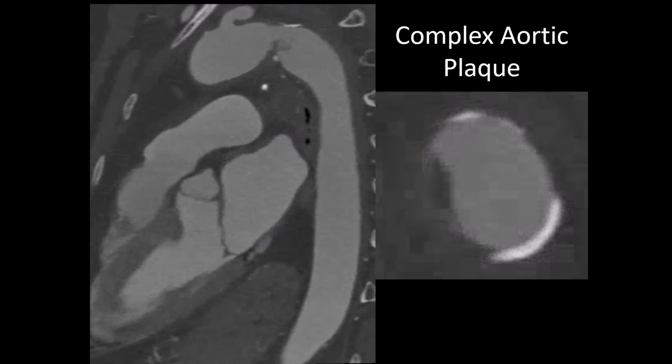That is exactly right. When we look at it in different views, there is atheroma at that area, and that is the same location. But it's clearly an atheroma that's become complex. If you think about a coronary artery, acute coronary syndrome, that's exactly what this is. This is an acute syndrome of the aorta where you have an atheroma where the cap sort of erodes or breaks apart, and then you get a thrombus that forms.